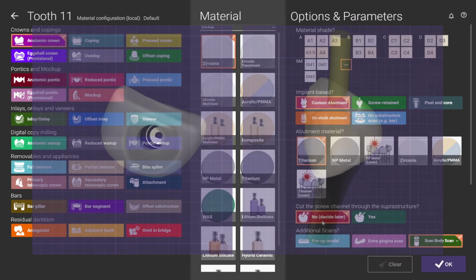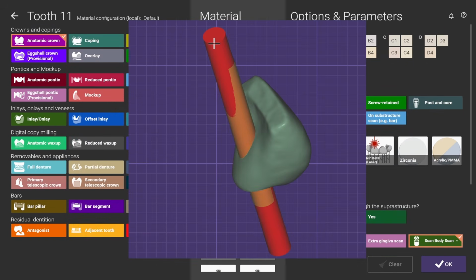Another reason also, if you want to create a bit of extra angulation on the screw access channel on the crown, you can further incline it a bit further back. Even if the screw hole is going to be straight, you can always bring it a bit back if you do it manually.